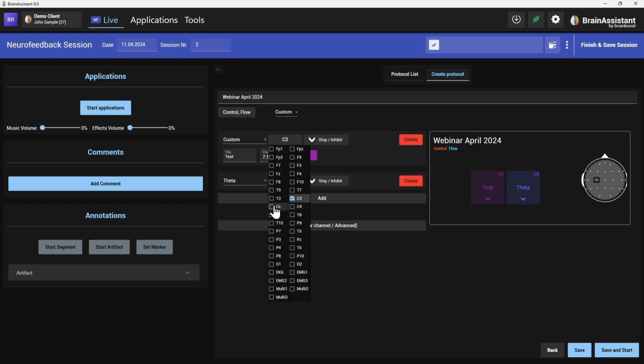Now, very important, this title says test. So it does not show at this point what frequency band is behind this. So maybe you want to write 7.5 to 9. Now I know it looks maybe a little cryptic. You can work a little bit with blank space and then you have it here. So be creative, don't be over creative. Give it a title where you can recall what it is.